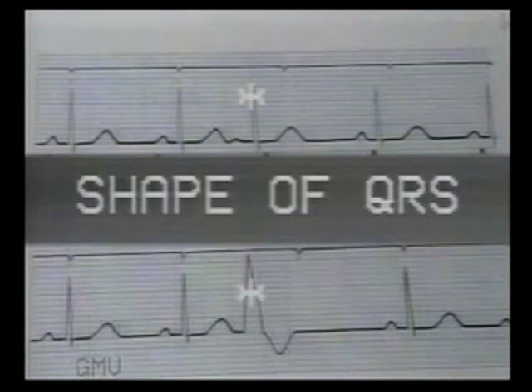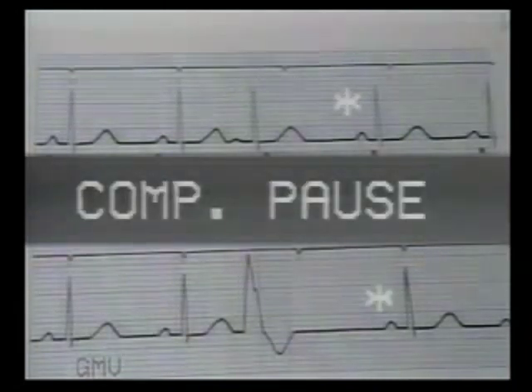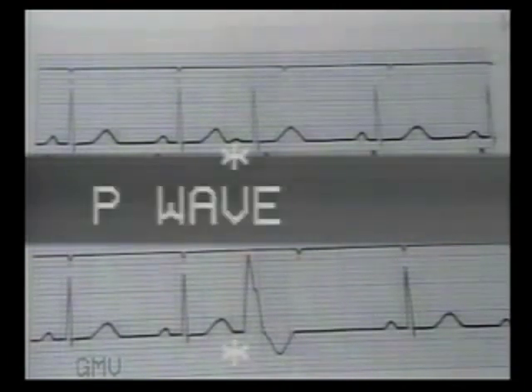Number 1. The atrial premature beat has normal QRS configuration, while ventricular premature beats have a wide and bizarre QRS complex. Number 2. The atrial premature beats have an incomplete compensatory pause, whereas ventricular premature beats have a complete compensatory pause. Number 3. Ventricular premature beats have no P wave. A preceding P wave is seen only in supraventricular premature beats, though it may not always be visible.